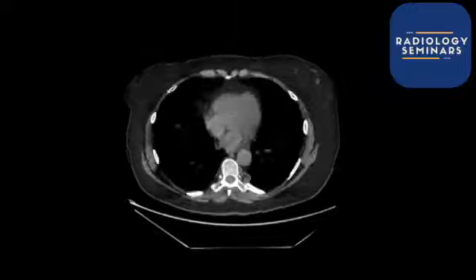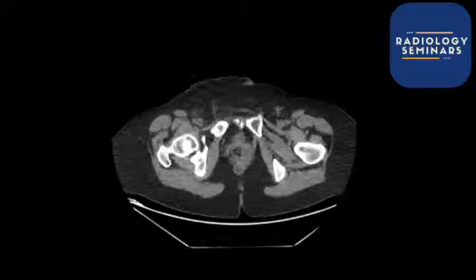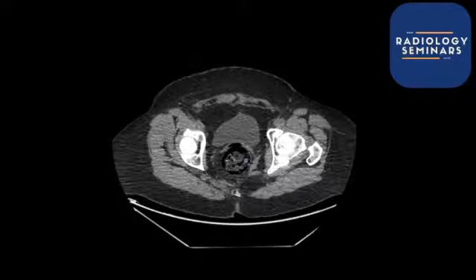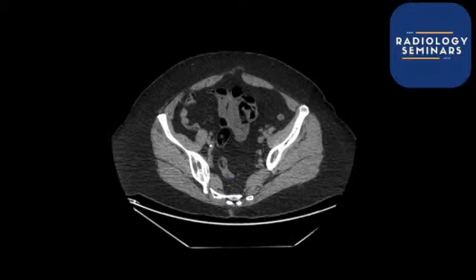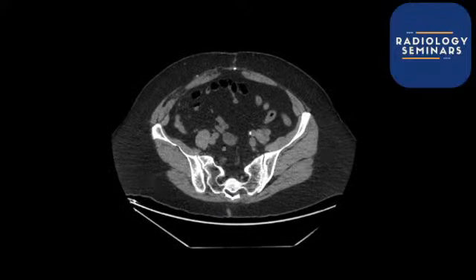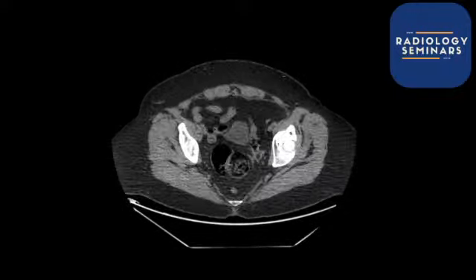So let's go from the bottom, quite literally from the bottom, so that we are used to looking through the bowel. For those of you that want to know how to do this, feel free to go through some of my older videos and you'll be able to find out how you go about doing this. But you can see I'm following the bowel, and it veers around this way, goes forward.